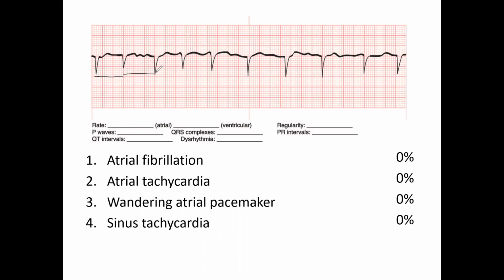Now we're down to a little over 2.5, so maybe 2 3/4. And then you got 2 and 2, so maybe close to 2.5. Then there's 3.5, 3.5, 3.5, 4, back down to 3. So if you're looking, and by the 3, 3.5, 2.5, I'm just looking at the amount of the large boxes in between your R to R intervals. So we'll look at that.